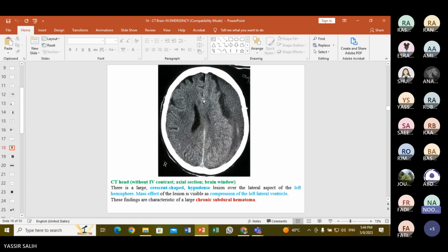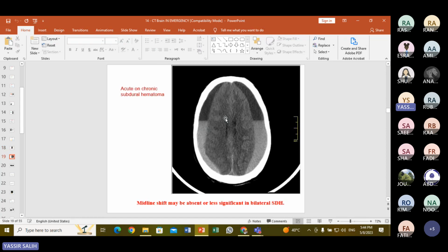Chronic subdural hematoma. Thank you. As she said, chronic. Why chronic? Because the collection appears hypodense. Why subdural? We did not say epidural, because the inner margin is concave. It is crescentic in shape. Thank you. Excellent.